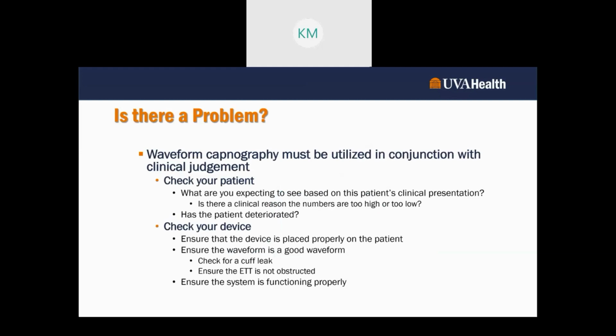Also, check your device. Ensure that the device is placed properly on the patient. Ensure that the waveform is a good waveform. And ensure that the system is functioning properly. There's a DOPE mnemonic for a reason, and E, equipment failure, is on it specifically for that.